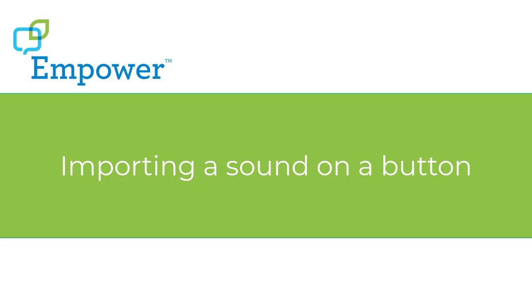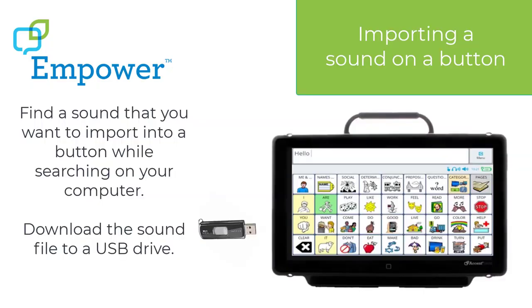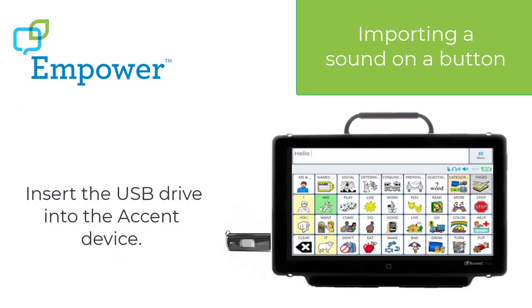Now we'll talk about importing a sound on a button. There are lots of different websites that offer free sound effects that you can download. First, find a sound that you want to import into a button while searching on your computer. Download the sound file to a USB drive. Insert the USB drive into the Accent device.